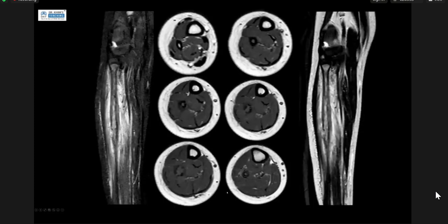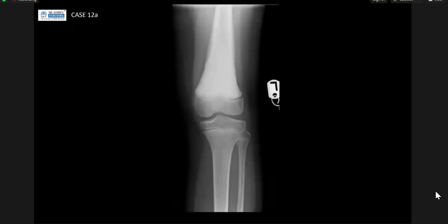The child went on to have an MR. I'm not sure the MR really helped to narrow down that differential. You can see how the LCH is actually quite aggressive appearing on the MR. So they were still worried that this was an underlying tumor and ended up having a biopsy. So I'm going to move on. Candidate 2.